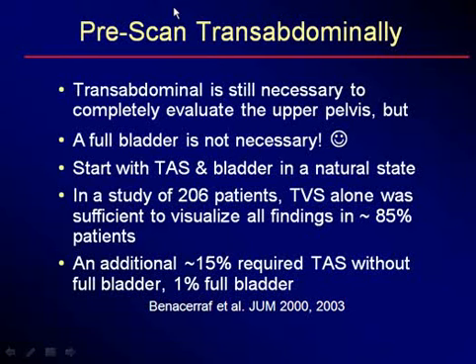Another way to avoid problems, pitfalls, is to pre-scan transabdominally. Now, transabdominal pelvic sonography in its pure form is no longer really practiced. What we're talking about here is still to take a look at the pelvis transabdominally, but not necessarily to have a full bladder. A full bladder is not necessary anymore. So we can have a patient come in a natural state.